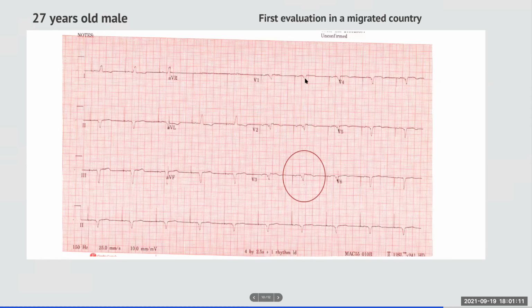And remember what Saqib says, in a normal ECG of athletes, the T wave inversion is usually only in V1 to V3. Once it has progressed beyond V4, V5, it's not normal. So yeah, but you have 1 minute. Okay, yes. So you have something at play here.